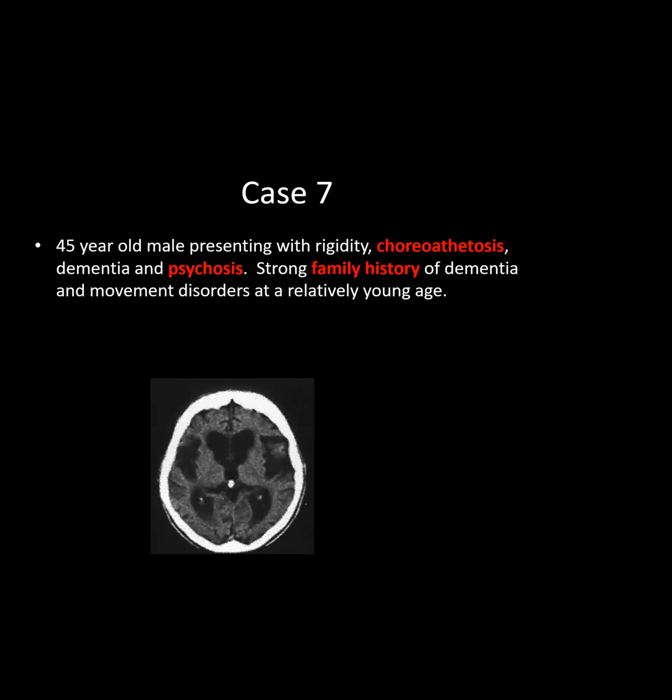So we talked about some tumors, including some slides on the ones that were on your in-service. I talked about hemorrhages in different spaces. I talked about a few different infections. I talked about a couple of metabolic things. Now I'm going to talk about a few different degenerative dementia examples. So let's see, Jihan?